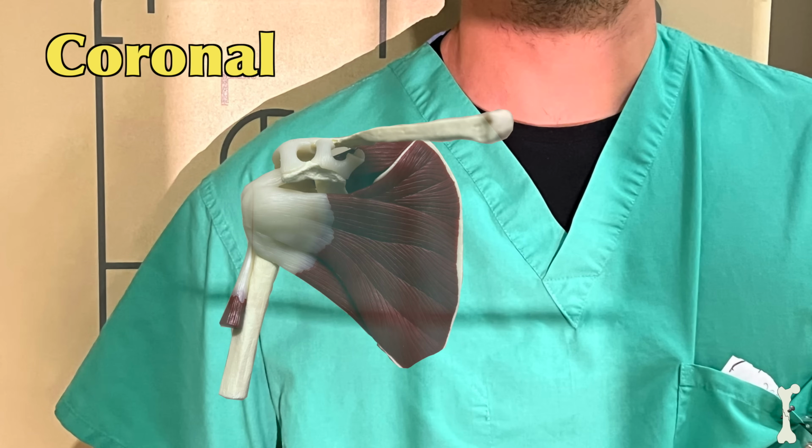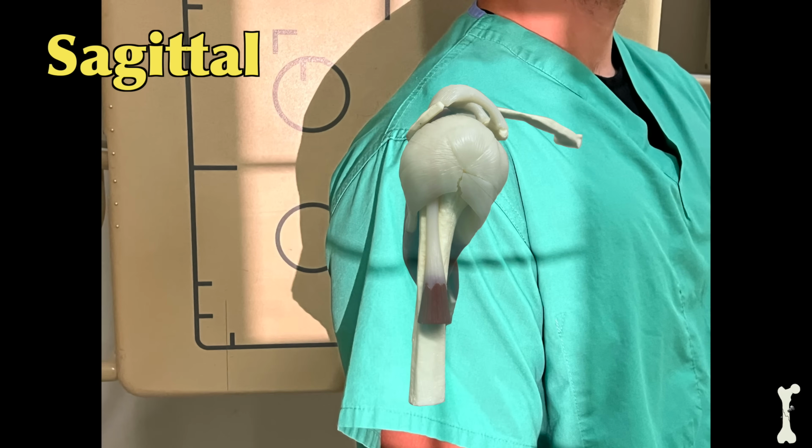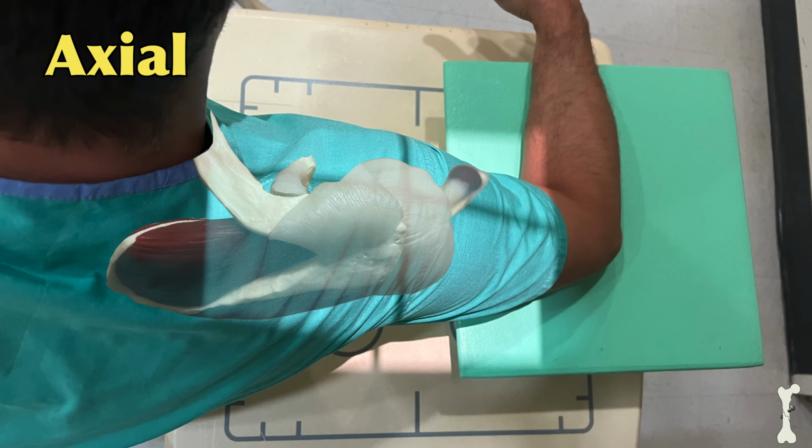There are three main sequences on an MRI scan. And you can think of these sequences as sort of like different perspectives when looking at the joint or other anatomical structure. So in this first image, this is looking straight at the shoulder joint, and we refer to that as the coronal. And the second image, which is looking from the outer side of the shoulder looking in towards the shoulder, is referred to as the sagittal. And then finally, looking from top down, this is referred to as the axial view.